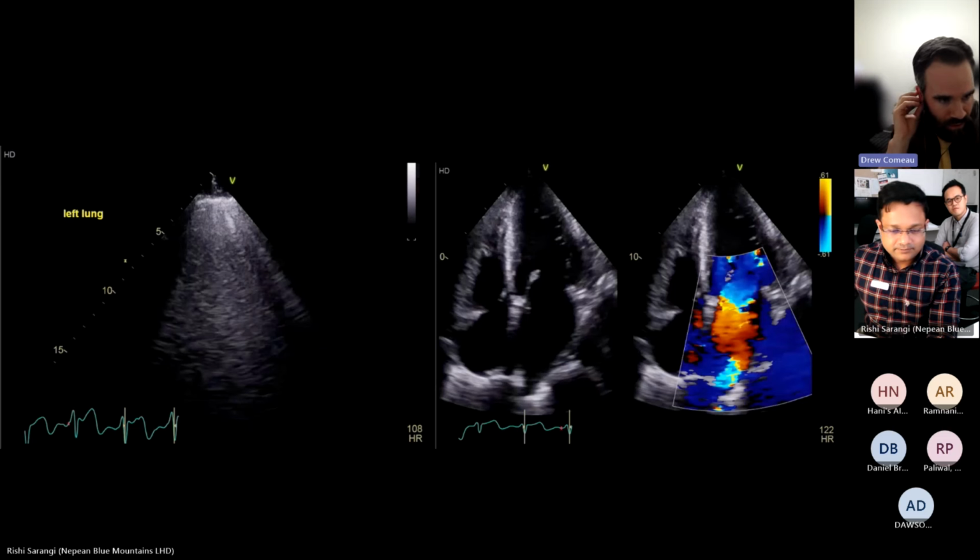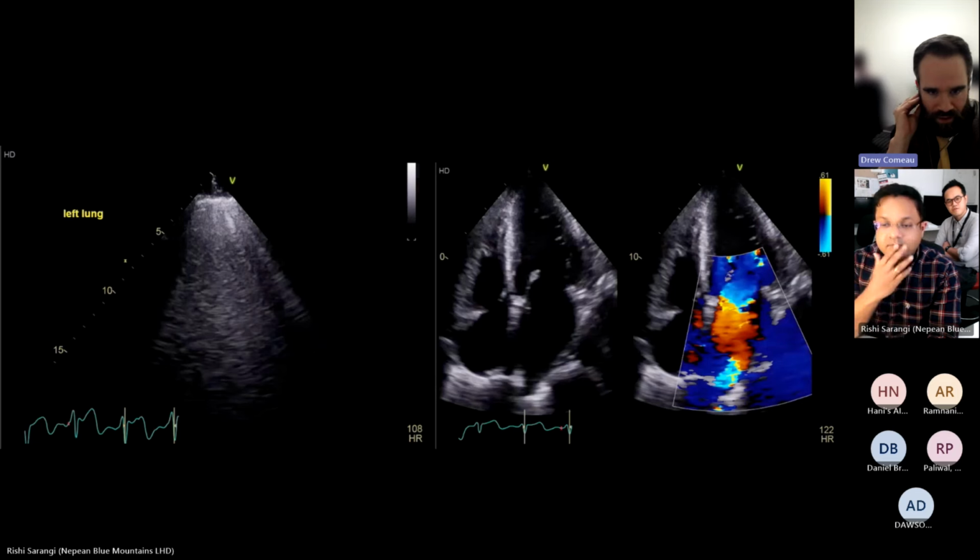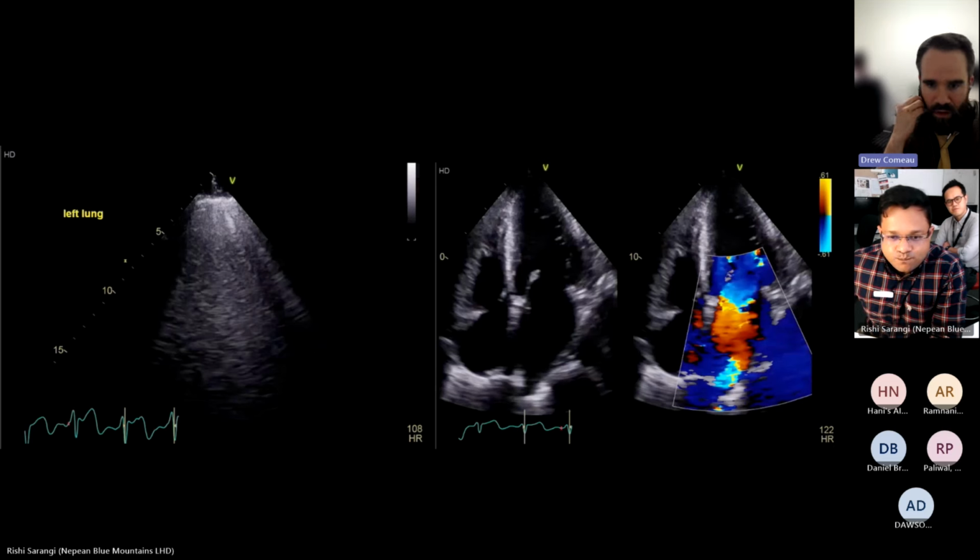On the left, you're showing me an isolated lung ultrasound. Usually I zoom in, but the pleural line is mobile and below is B line pathology. And then on the right side, you've got a left ventricular function that is preserved, with a posteriorly directed eccentric mitral regurgitation that likely shows flow reversal as well. Right side size and function is intact.